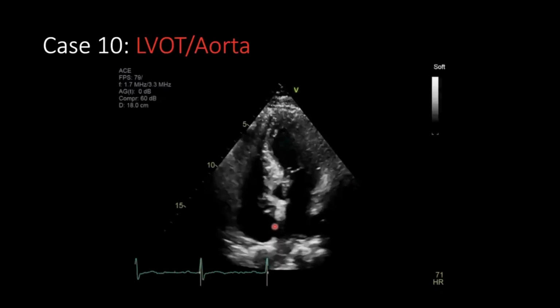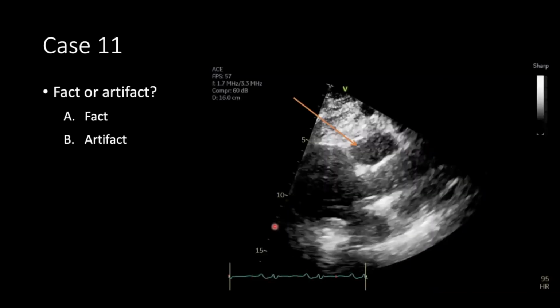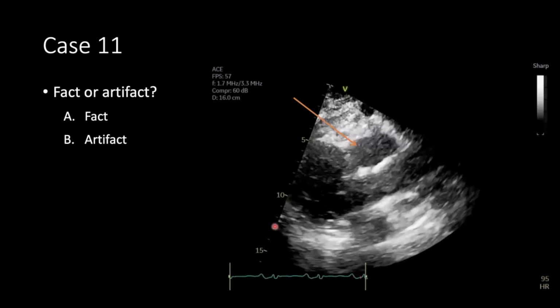They saw this, and there are many views since they look at it from different angles, and it's very clear. It's just a fine chain. There's no mass. When you record these pictures, you have to remember how your reader is going to read it in that context. It can be very confusing.